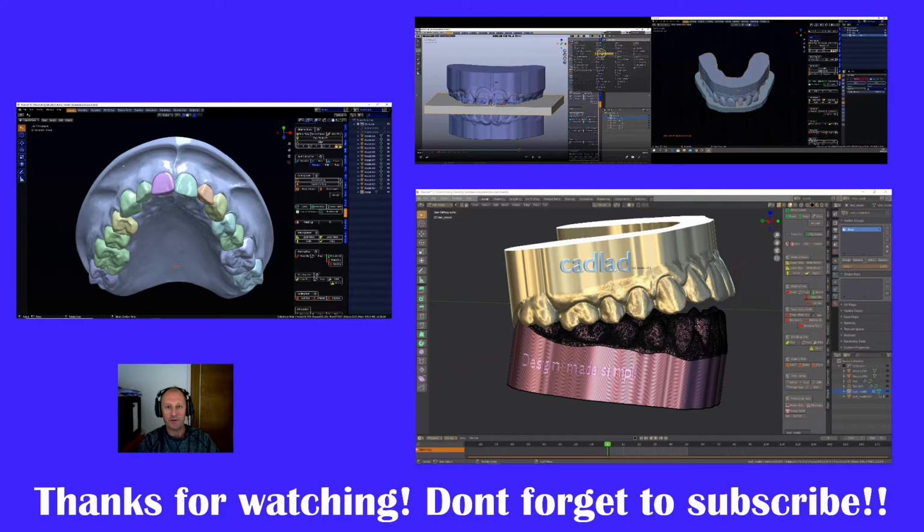I'm going to whip through the first bits because I want to try and keep these videos as short as possible. And since we've already done it in the first video, you'll see a lot of repetition on it. It's no bad thing. Have a look at it again. The more you do, the more times you practice this, the easier and the quicker it will get. So without further ado, let's get going.